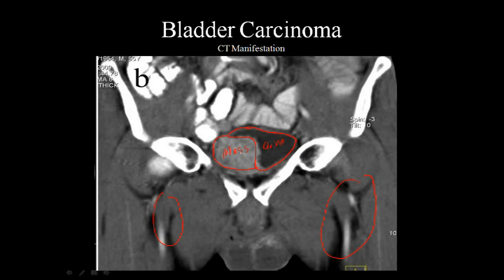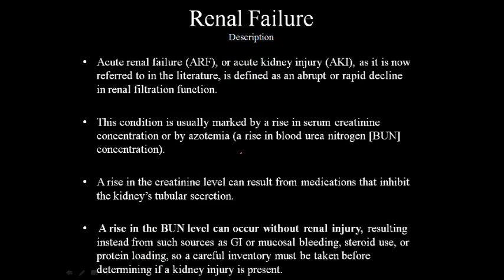So a bladder carcinoma is very difficult to miss. Usually, if you have any amount of urine in the bladder, it's going to be very easily seen. I saw a couple, well, actually probably 3 or 4 cases of bladder carcinoma, and they each look like this. Maybe not to the degree where they're that enlarged, but the patient does present with symptoms of dysuria, things like that, or urinary frequency. And it's usually in your elderly patients that actually have this.